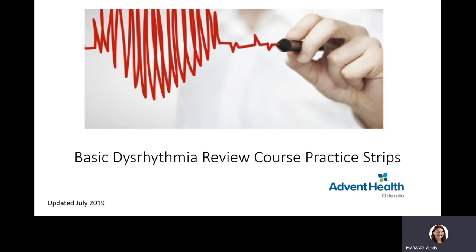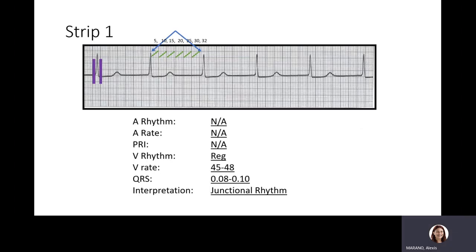Let's review some EKG practice strips. As we go through the strips, we will pause so that way you can pause the video. Work on answering the strip yourself, then come back and press play to review the answers. So let's start with strip number 1.